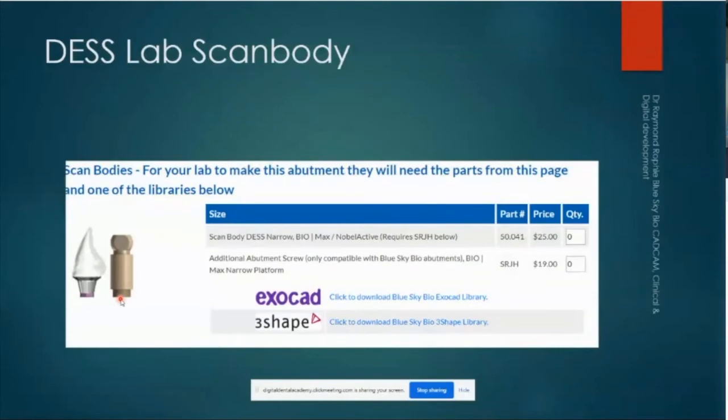If you ever had experience with intraoral scanners, scanning metal requires either the new generation of scanners or powder. Using a scan body is way easier because they absorb the light. They are made in PEEK or white or different materials that do not reflect light.